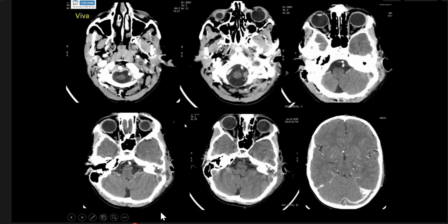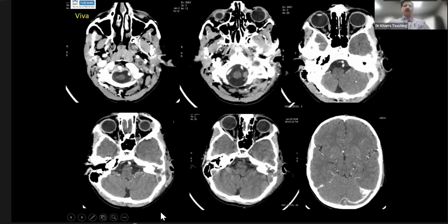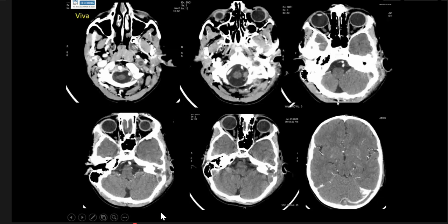So I'm just suspicious of a thrombus, but looking externally as well, there appears to be some enhancing soft tissue external to the region, seen at the upper right image. Yeah, this one here. Yes, some external soft tissue enhancement. I'm not sure what that could be, but the filling defects could represent thrombus. Then looking externally, that one could be due to an infection.